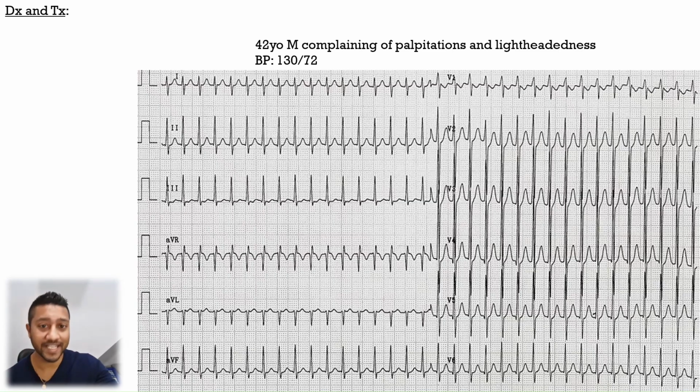So let's now take that method that we just learned and employ it for a few of these EKG cases. In every one of these cases, I'm going to present you with a clinical vignette. And remember, that's very important because often we're asking ourselves, is this patient stable or unstable, pulseless or having a pulse? And that can change your management.